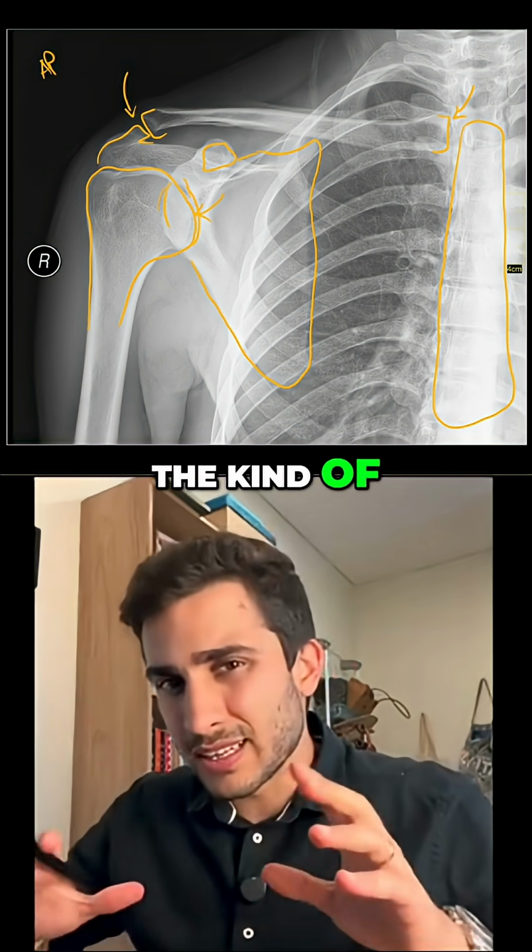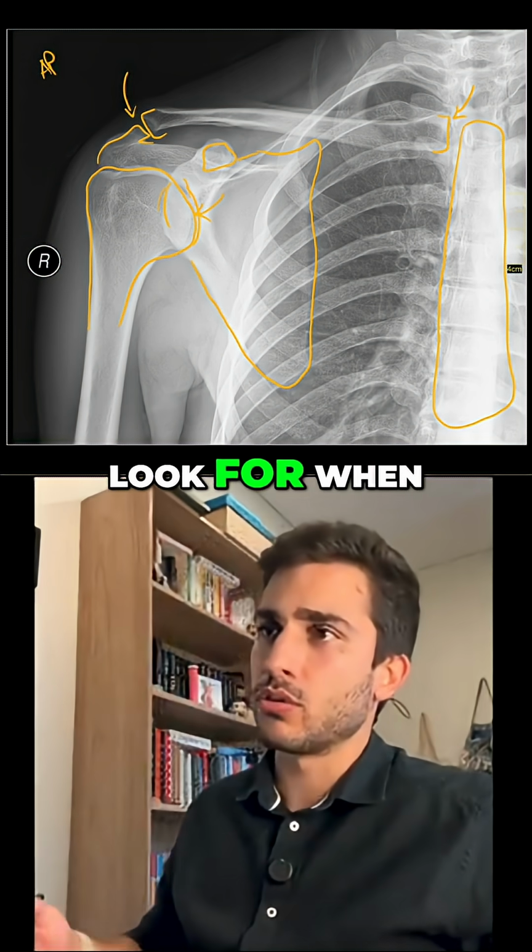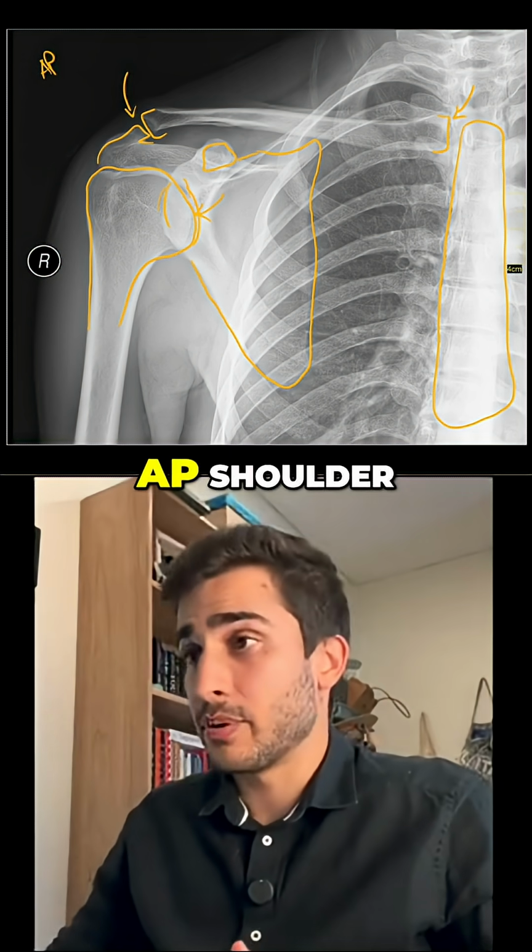Those are the joints and anatomy that we're meant to look for when you're looking at an AP shoulder in this case.